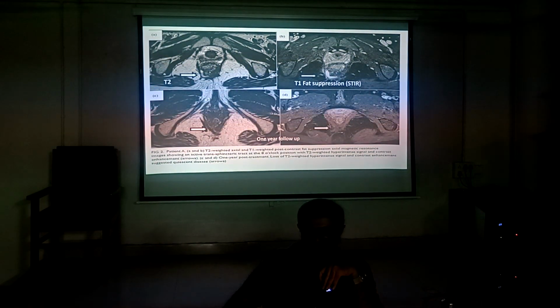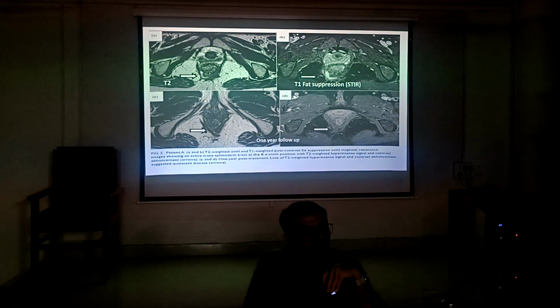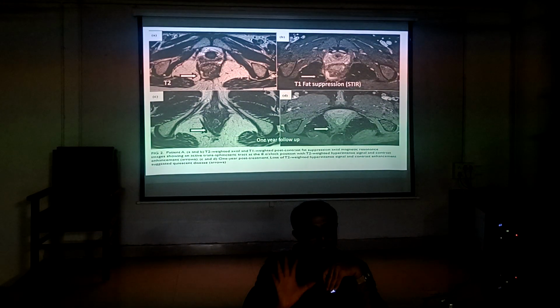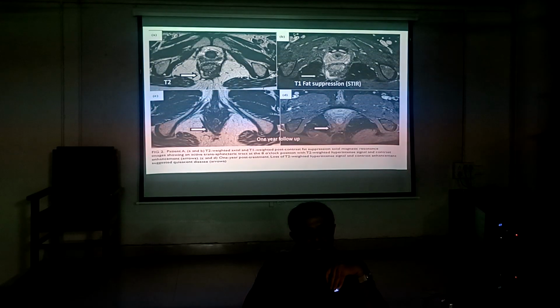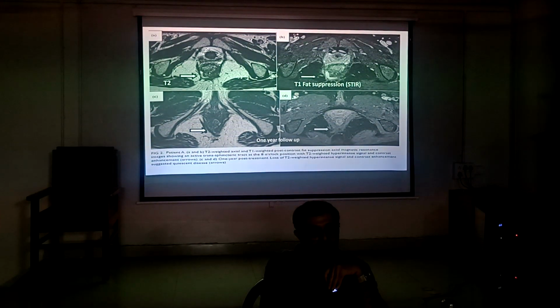It is MRI for fistula, perineal fistula. So we usually do MRI. It is compulsory before fistula surgery. So that is how we can identify. In short, T1, fat suppression, and T2.